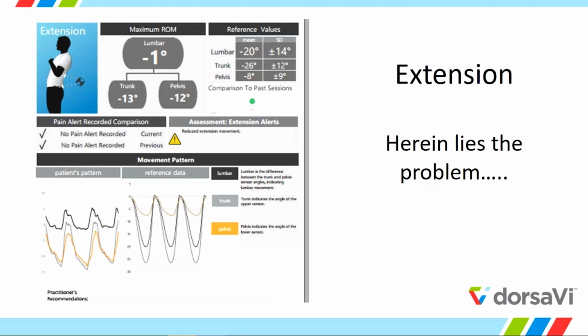For example, if you have a younger client who has a spondy, when they're standing and doing anterior posterior pelvic tilt loaded in stand, they might not like going into extension, so you'll see a reduction in their anterior pelvic tilt. I saw a specific example where the guy had no anterior tilt in stand, and when he sat, his pelvic range was great.